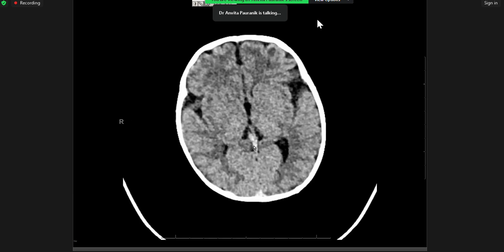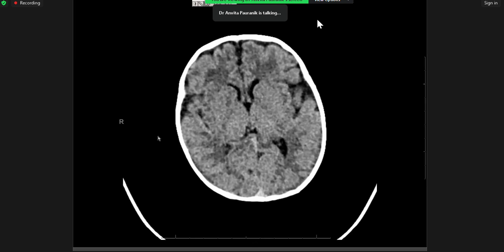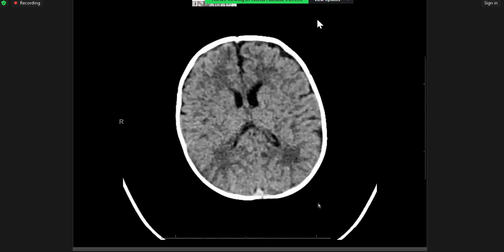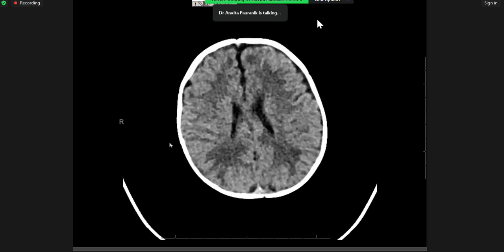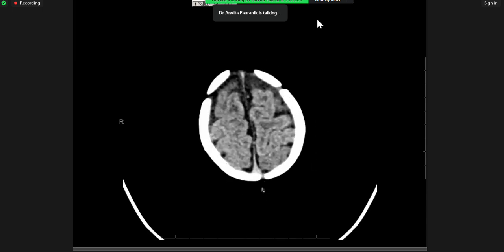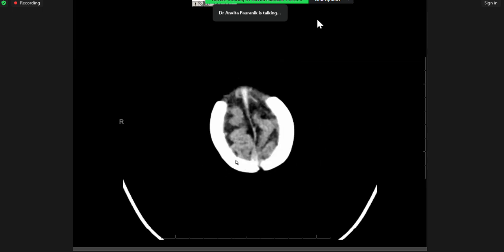What do people think about this high density in the venous sinus? Right. Dr. Keder has mentioned dural sinus thrombosis. CVT is the same, right? Yes, ma'am. Cerebral venous sinus thrombosis. Okay. What else? Arisha has written normal. Okay. So let's see. Slow flow, anemia. Okay. So we are debating whether this high density in the venous sinus is normal or is this thrombosis?